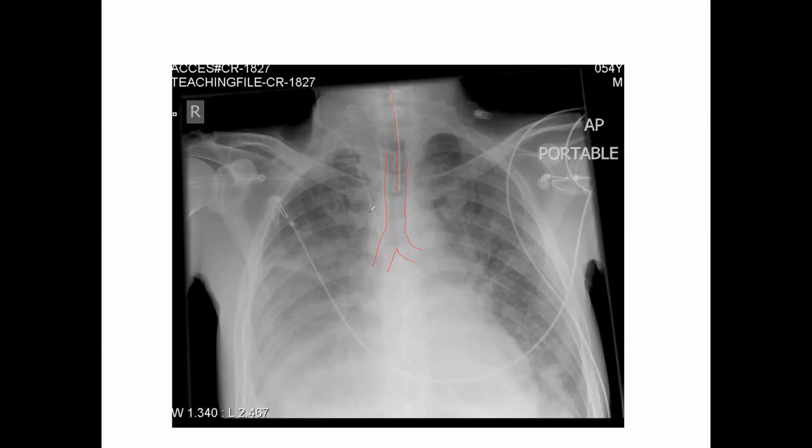It's possible the practitioner might decide to advance this tube by about a centimeter to get the tip of it a little bit deeper, but that would be dependent upon your practitioner and what that true measurement would show when you go through the unit. So knowing that it's in the tracheal tube, you can see this item right here.